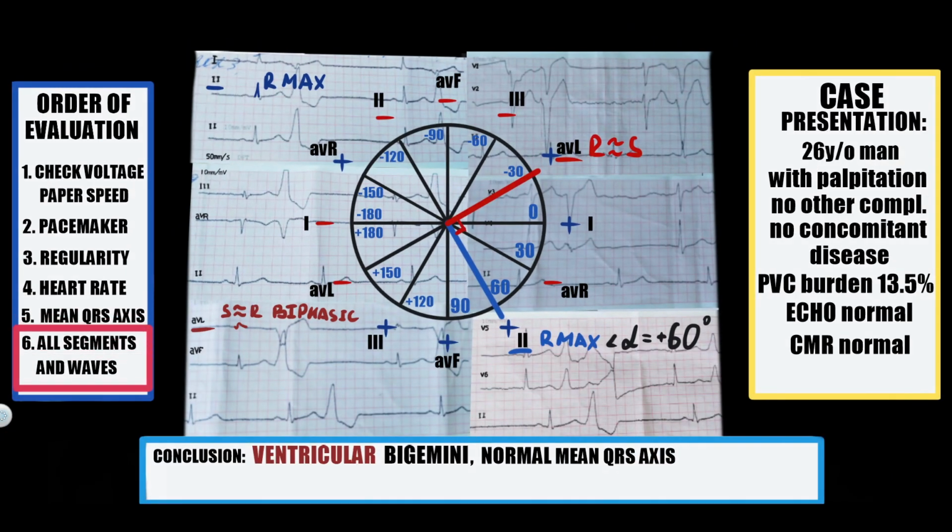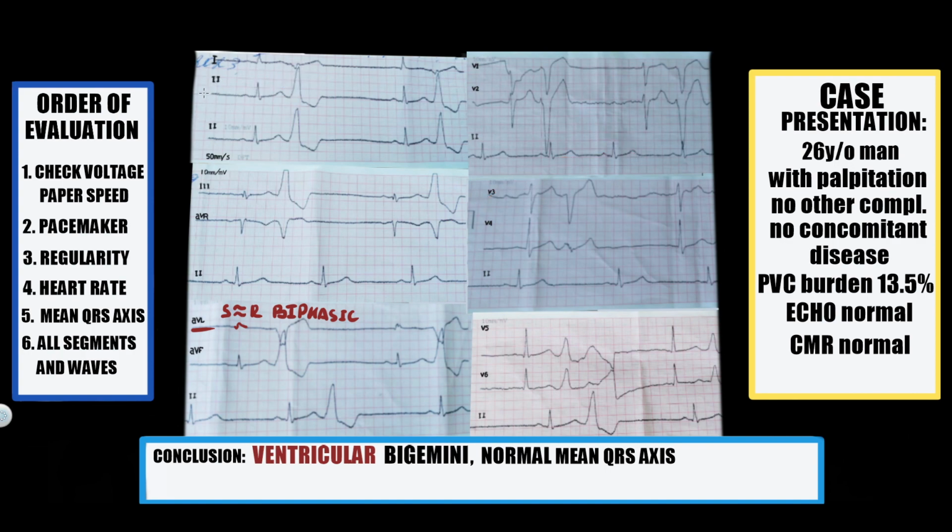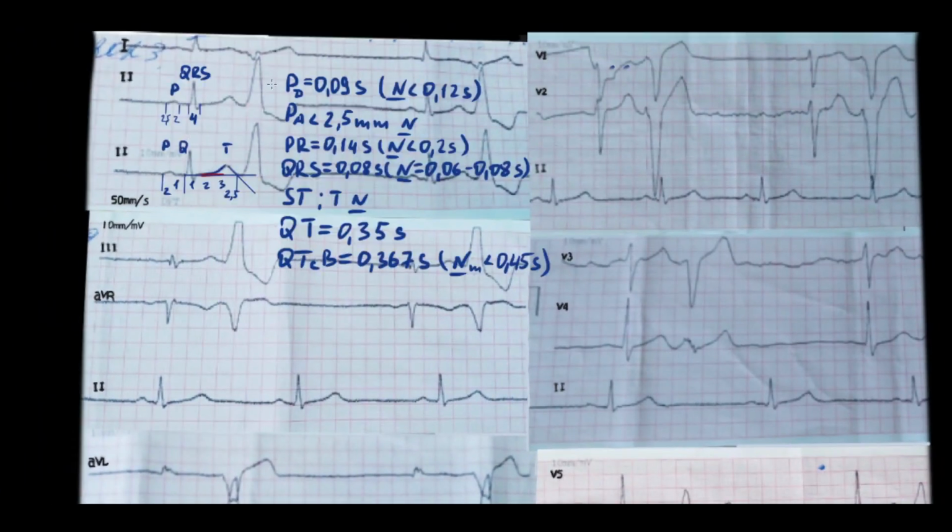Next step is one-by-one evaluation of all waves and segments. All waves and segments are in normal range, so for saving your time, I will add the results of their measurements. If you need a detailed check, press pause.